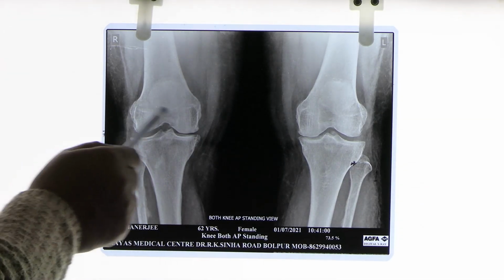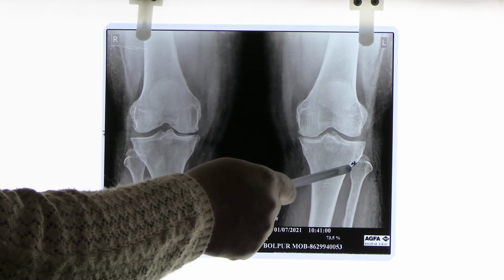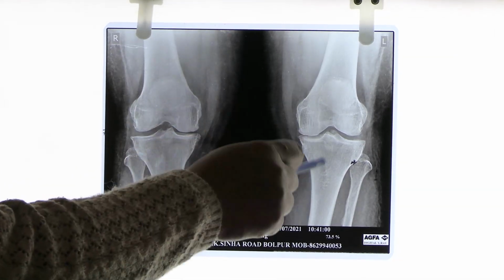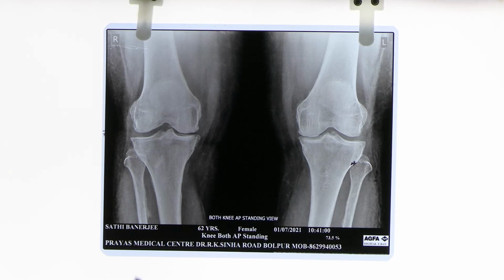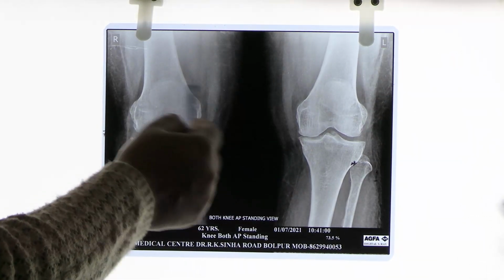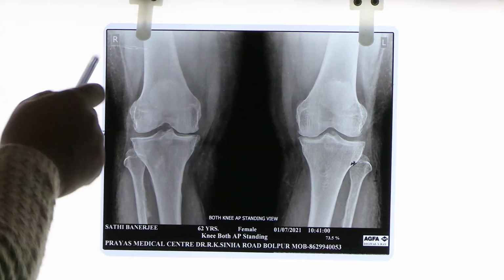And this prominent point here is the epicondyles you have read in femur. Here it was sometimes given in your exam, the type of the superior tibiofibular joint may be asked. You will be able to identify and see here it is more white. Here the patella is superimposed. Both knees are there. Only AP views here. This is left side, this is right side.